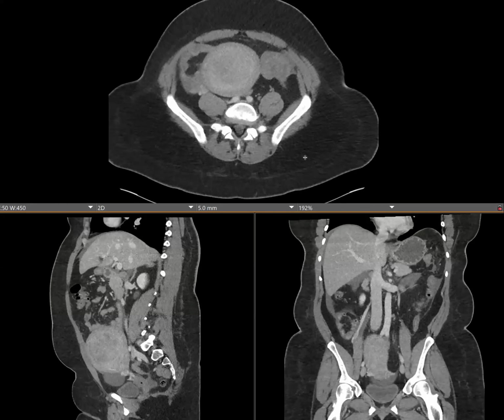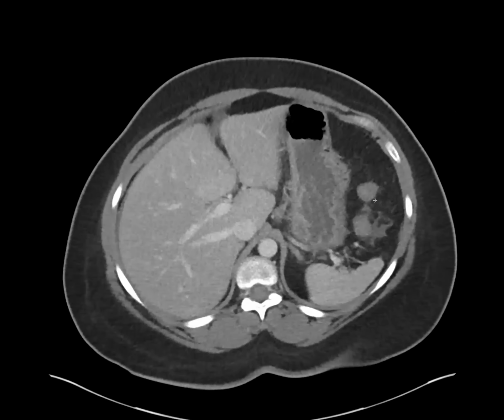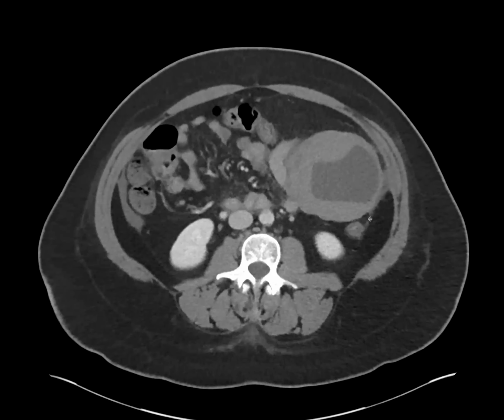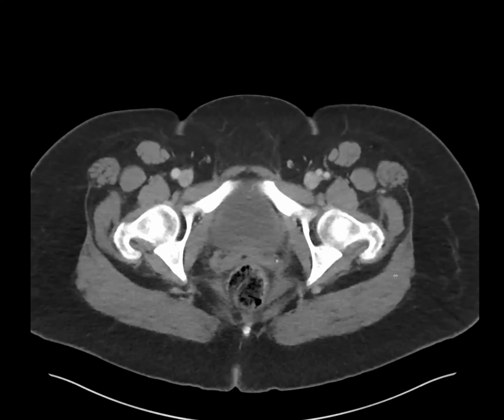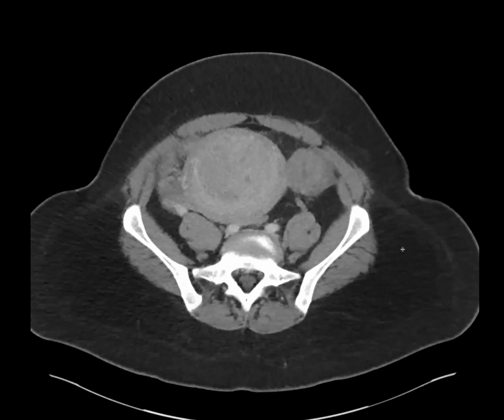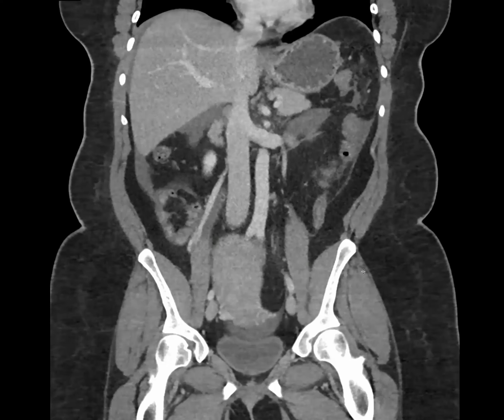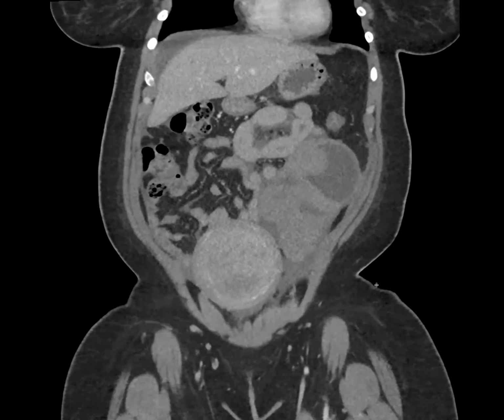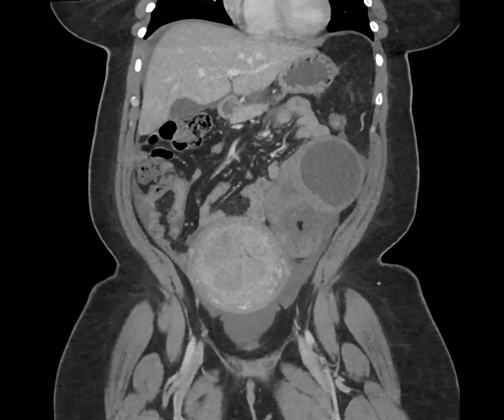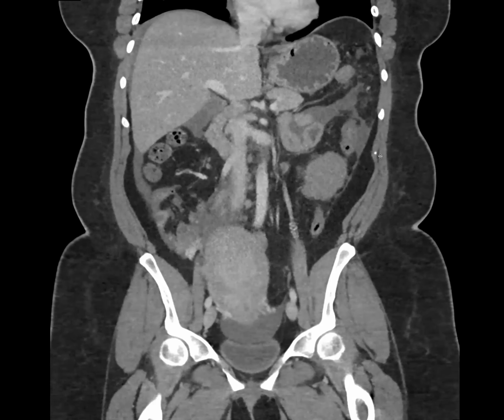This was a female in her 30s presenting to the ED with abdominal pain. So I'll just scroll down. What's her HCG? It was negative. That odd thing on the left side looks almost outside of the uterus, like adnexal. Is it ovarian, or potentially from the uterus? It's a left adnexal, cystic and solid bilobed lesion.